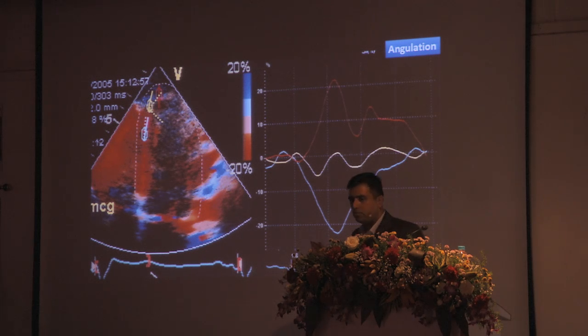And finally, angle. Now, tissue Doppler, as all of us know, is angle dependent. If it is straight, it's great. If it is there at the corners, it is entirely different. The computers compensate a lot for it. So it's measuring base, mid, fantastic tissue Doppler. But if it comes to the apical segments, there is a problem, because our beam is straight versus the apical segments are contracting differently. So instead of actually measuring longitudinal strain, you will actually be measuring radial strain. So that is something you should keep in mind while doing strain and strain rate at that.